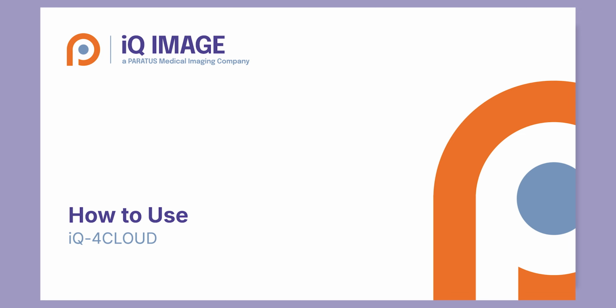Hello and welcome to the introduction for iQ-4CLOUD. iQ-4CLOUD is provided by Plum Medical Solutions and is an ideal tool for receiving, distributing, and reading images in the cloud. It functions the same as a PACS with the convenience of running from a remote server.